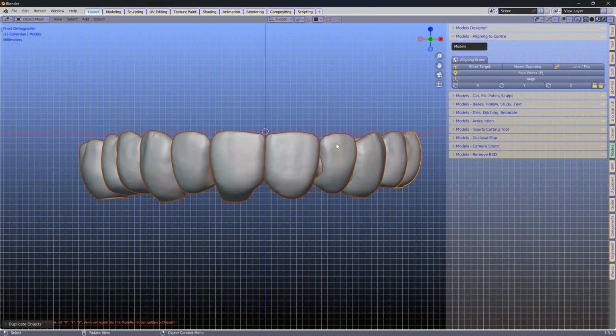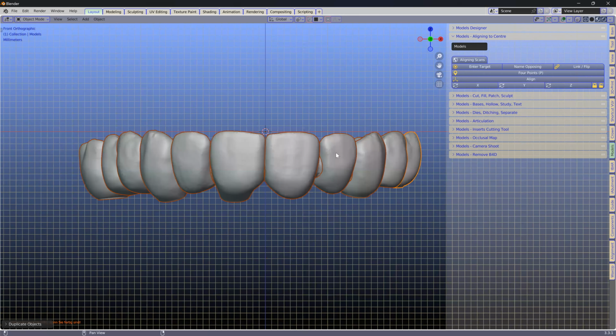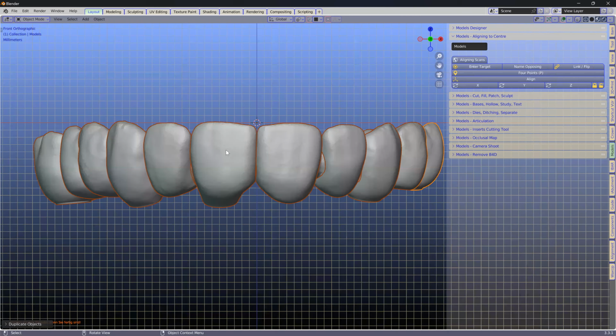It takes the shortest route. So if it is upside down, all you need to do is swap it around on the axis, because this is the y-axis. It's looking straight at us. The red is the x, and the blue is the z-axis. And then you would just flip it around, you see? Okay, so this is where we want the eyebrow to start, with the teeth going up. That's a must.